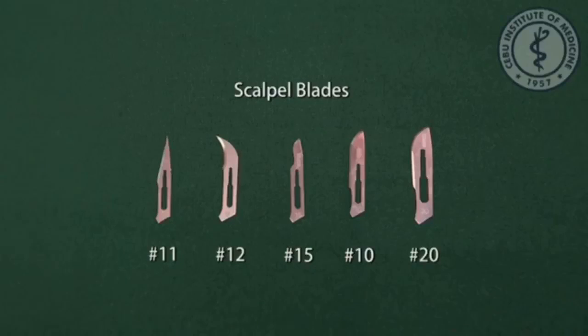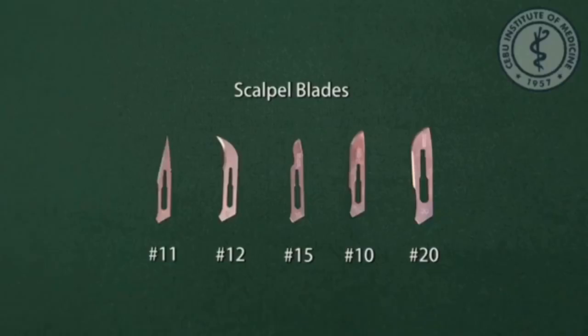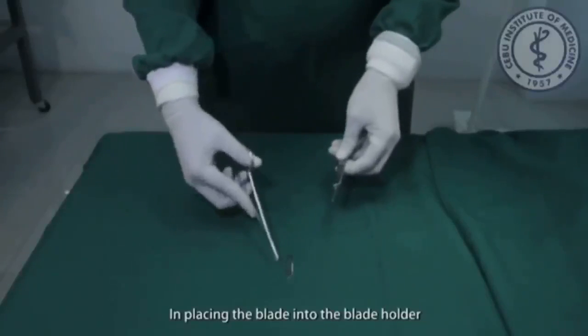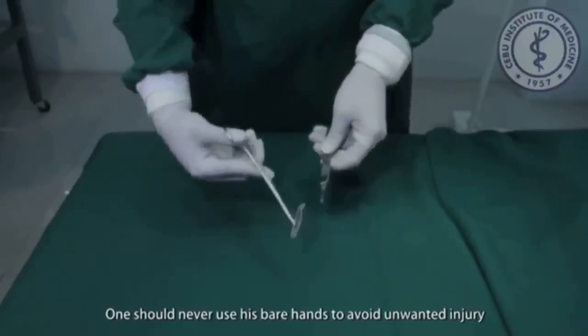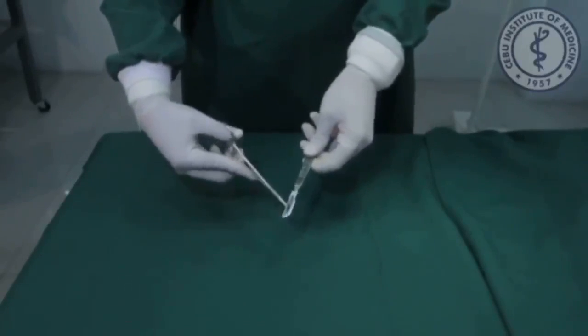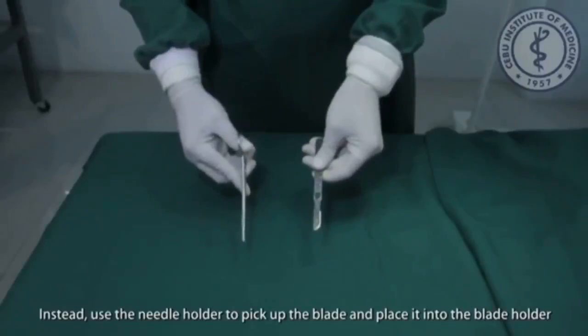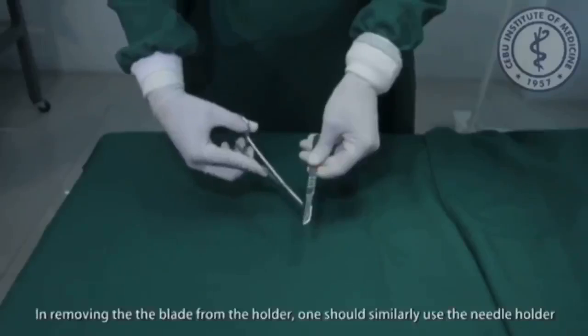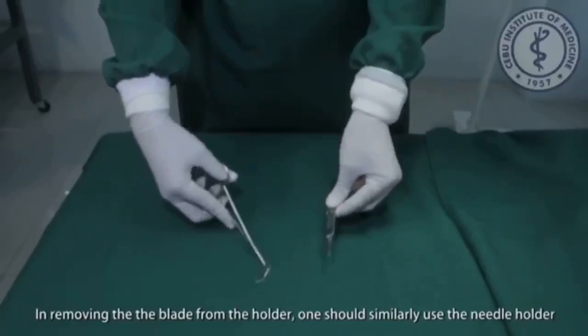Blade number 20, a large version of blade number 10 with a curved cutting edge and an unsharpened back edge, is used for orthopedic and general surgical procedures. In placing the blade into the blade holder, one should never use his bare hands to avoid unwanted injury. Instead, use the needle holder to pick up the blade and place it into the blade holder. In removing the blade from the holder, one should similarly use the needle holder.